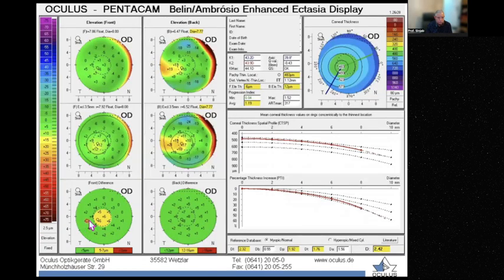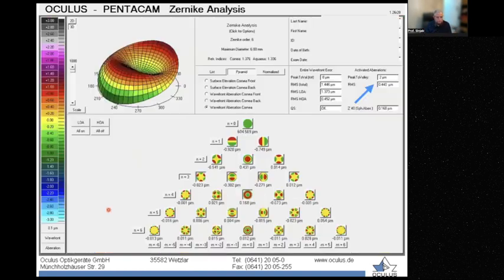Belin Ambrosio shows something abnormal because it's myopic. It shows these things abnormal. And although it is consistent, immediately after the 6 it goes down. We can consider it normal, of course, but as you see, it is a collection of some annoying things.